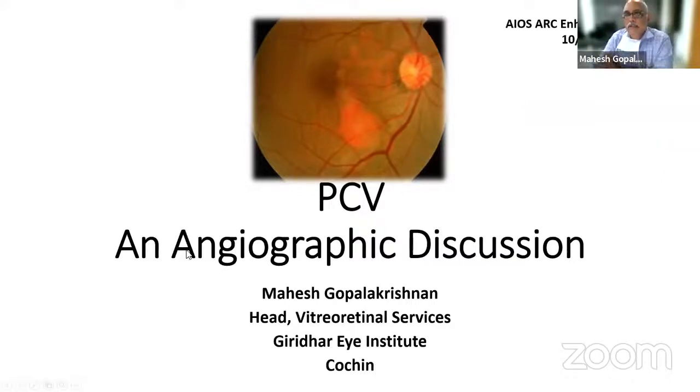So I will be talking on the angiographic patterns of PCV, mainly ICG angiography, because fluorescent angiography does not have much of a role in the diagnosis of PCV. And OCTA I have not taken because I thought this was a basic course.